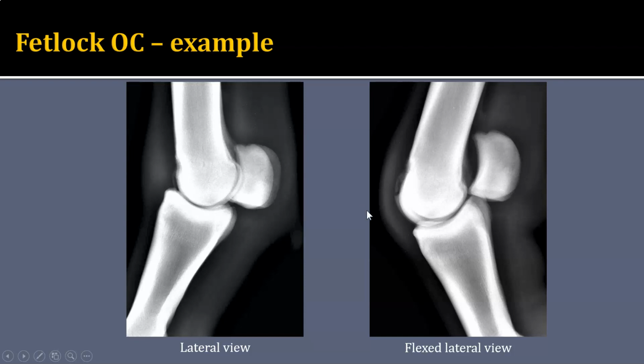So this is why it's so important for you to know the exact location on which bone we will find osteochondrosis. We don't want to confuse these lesions with something like a sequestrum or a fracture. So whenever you look at a joint, remember where to look for these osteochondral fragments and defects associated with osteochondrosis.